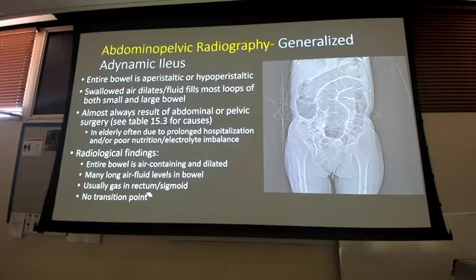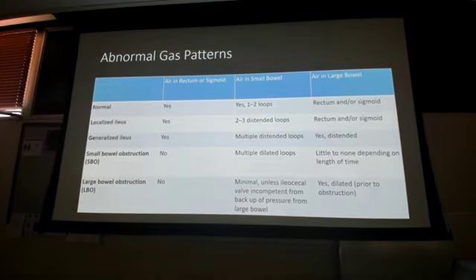That's going to help you with an ileus as well, because you're still going to have gas in the rectosigmoid area. So if you look separately here, I still got some gas in that rectosigmoid area, whereas in my obstruction, that gas is likely going to be gone, because that's the first gas to leave, right? And if I'm obstructed, nothing else is coming out behind it. Okay. We'll look at more pictures of this.